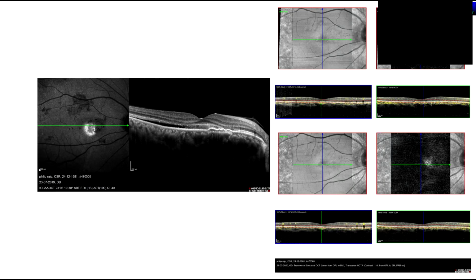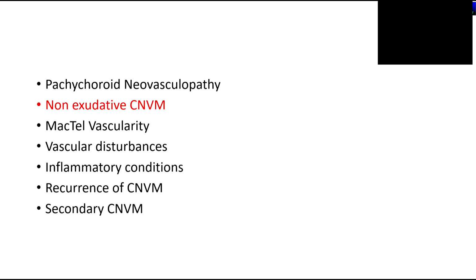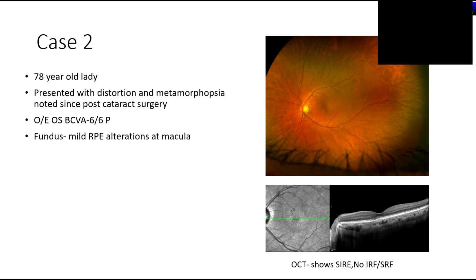networks. Again, here there's some shallow fluid, and then the FIPED, or the shallow irregular, which is the diagnostic OCT sign corresponding to an OCTA vascular network underneath. So in pachychoroid neovasculopathy, the angiography shows a lot of information, but the OCT is diagnostic.